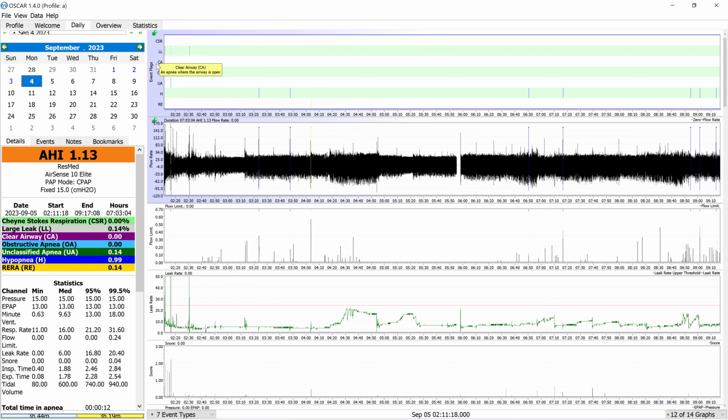Here we have what are event flags throughout the night. So on the bottom, these pop-ups. On the bottom, you can see we have the time of the night on the x-axis. So here's 4:50 a.m., etc. And in the graph, you can see all these little lines. Well, this line, for example, is a hypopnea that happened around 3:50 a.m. And I know it's a hypopnea because right here is the hypopnea column, or row rather. This is the row. So I had one here, etc.